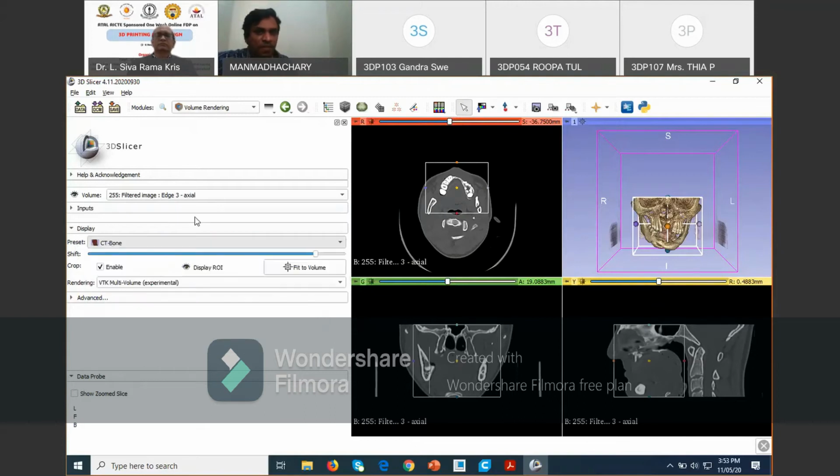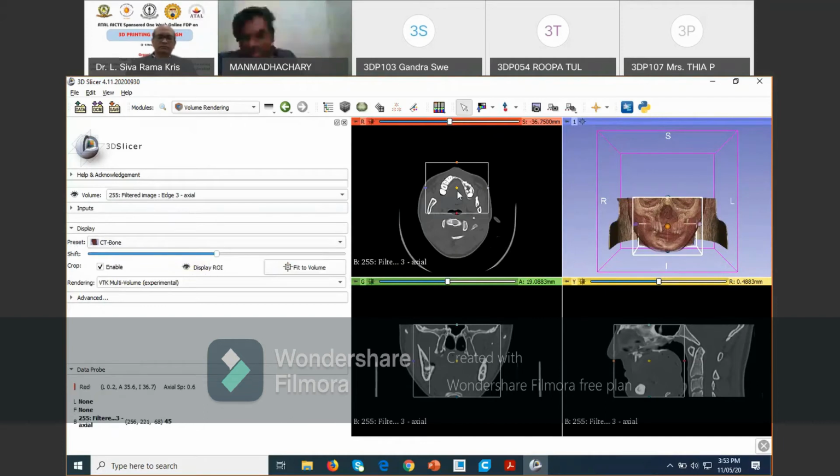Clicked, sir. Okay, then here there are some boxes. Yes, the crop box is there. You have to adjust how much volume is required. If suppose you are not adjusting, also no problem. Okay, you can get the volume. If you want, you can do it.